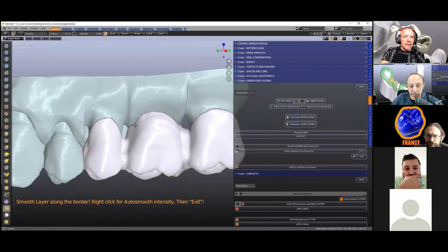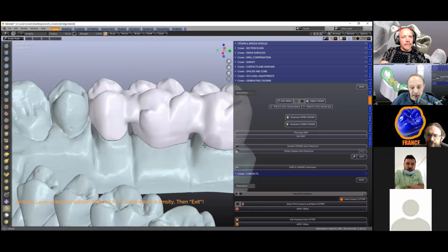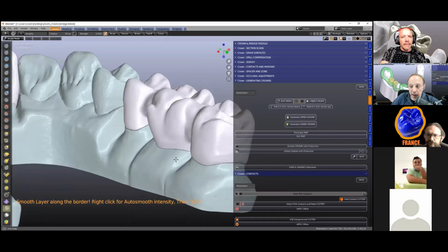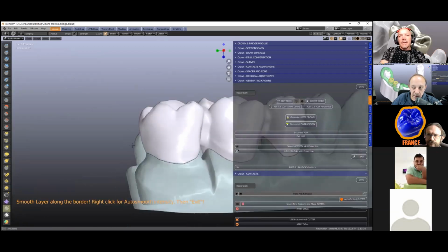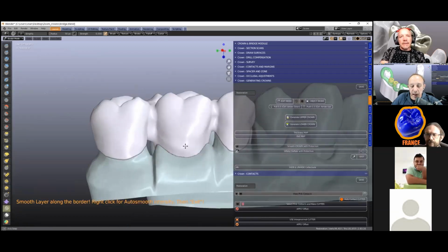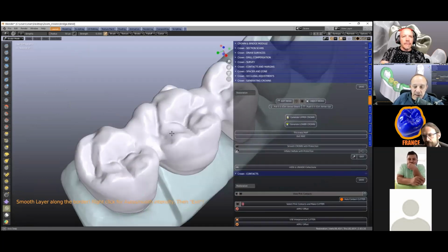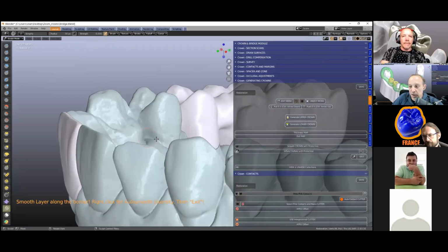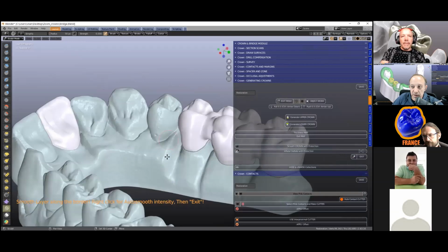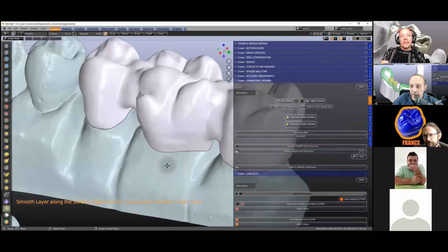I've got a question, Michael. On the fitting surface of the pontic, it is now protected, so we can't actually smooth that at all anymore. Is that correct? No, it's protected. Yeah, all right. What's the offset that you use to cut the tissue fitting surface, underneath the pontic, between that and the pontic? It's 0. Oh, okay, 0.